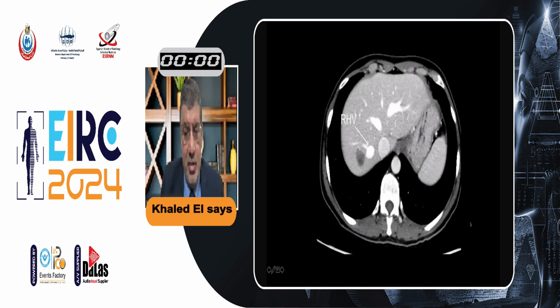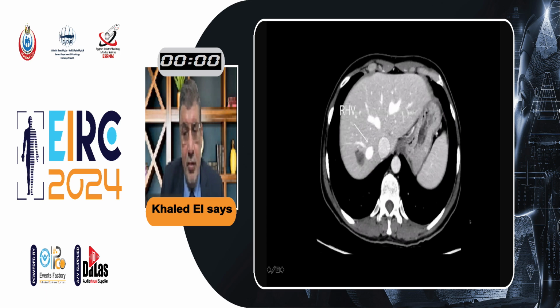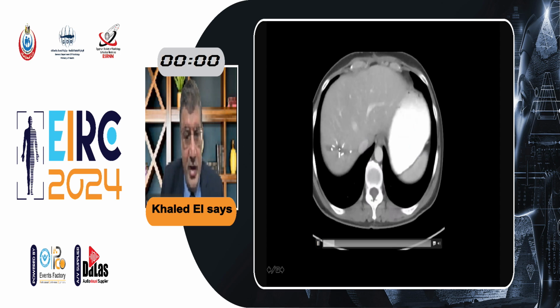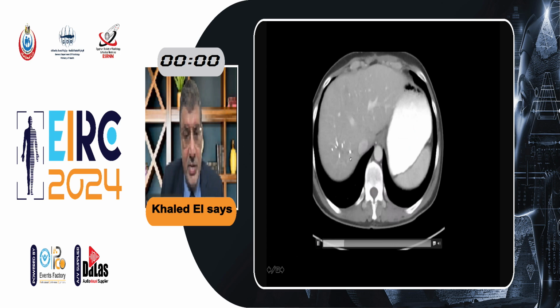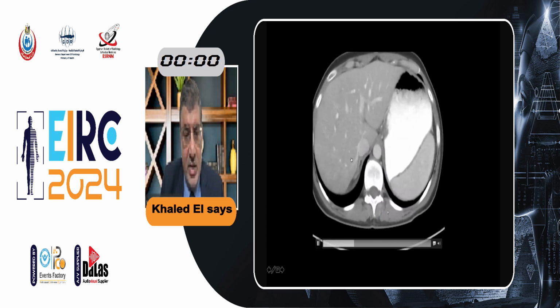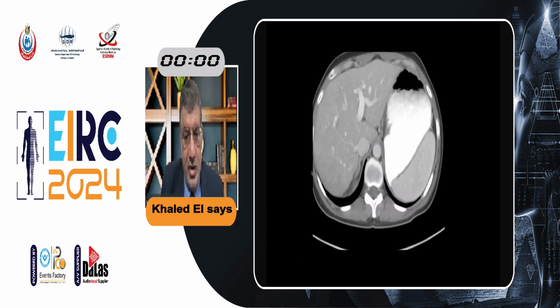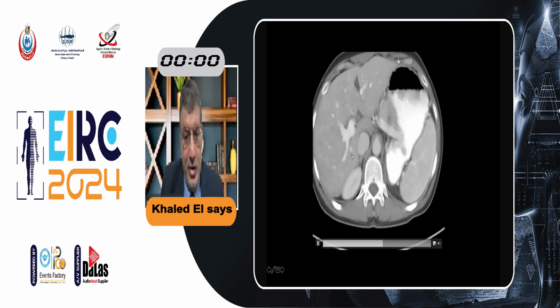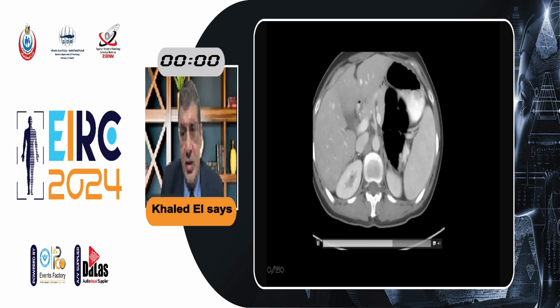But those are examples of these variants. And here, this is the post resection. You can see here that this is a very localized resection of a segment 7 metastasis. And you have spared here segment 6 of the liver because you see the right inferior hepatic vein draining it. Okay.